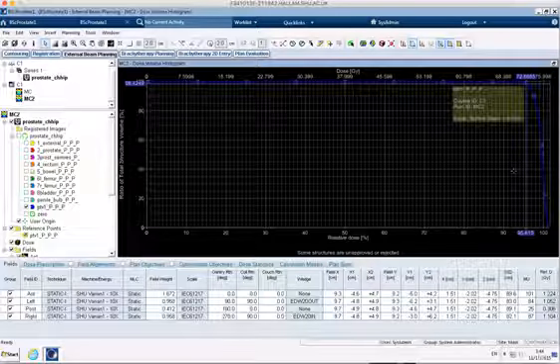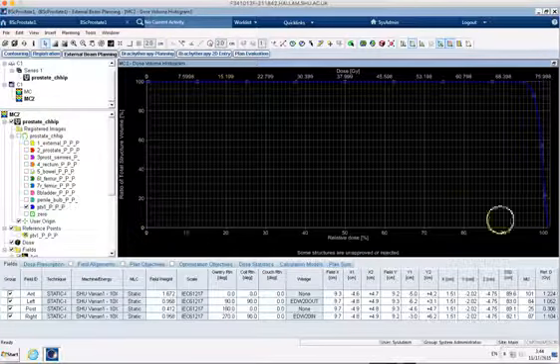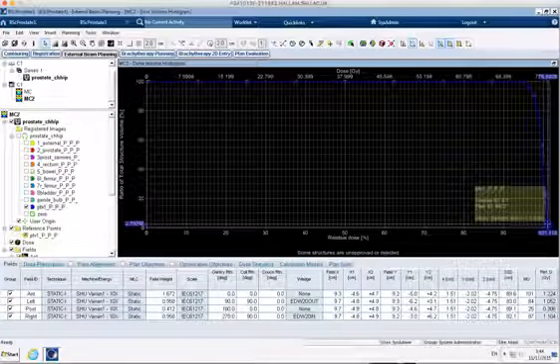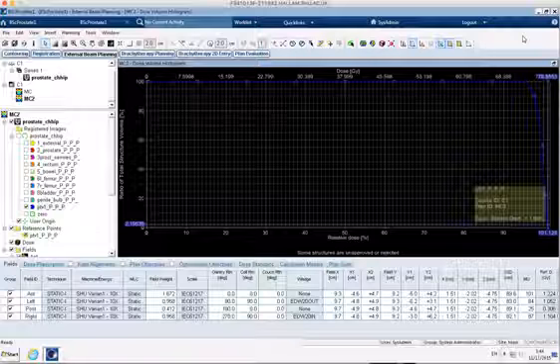And our D2 was less than 105, so D2's down here somewhere. So let's work our way across here. And actually, I know that that's going to be in because I could see that from the plan. So that's okay. D98 is just about in tolerance, so we're just about covering the PTV with 95%. But actually, I think we could make that quite a bit better.